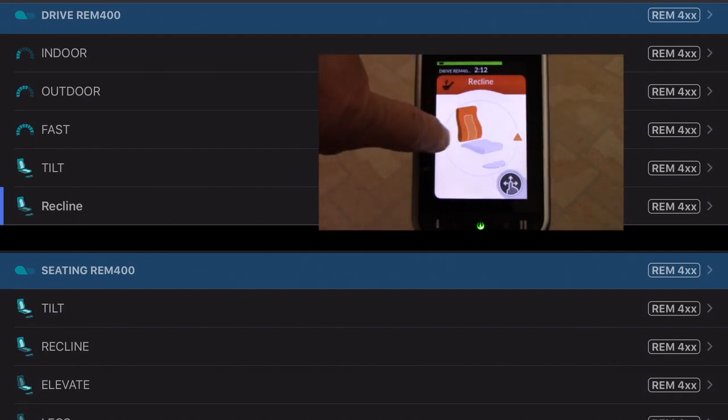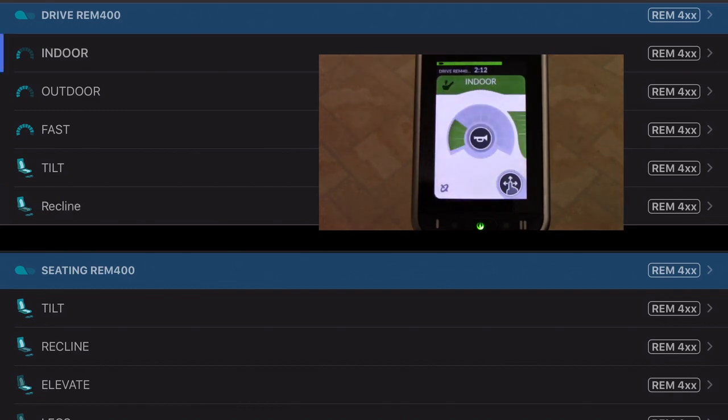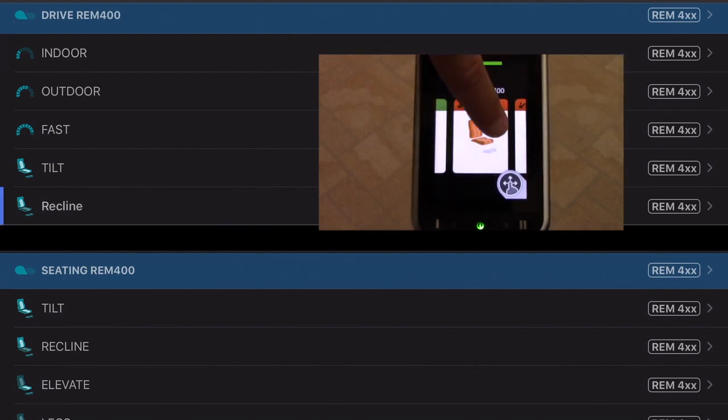So I keep going, and I'm back around. This is a matter of just swiping. I can go in a circle. I can swipe in either direction. Doesn't matter. This is a touch screen either way.